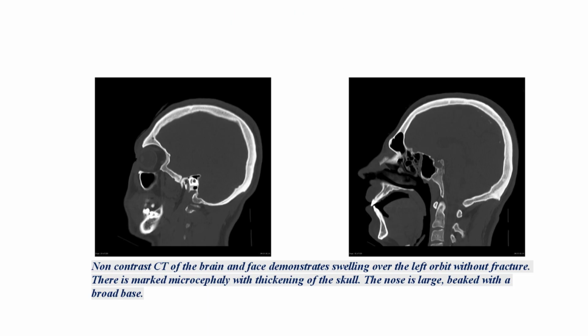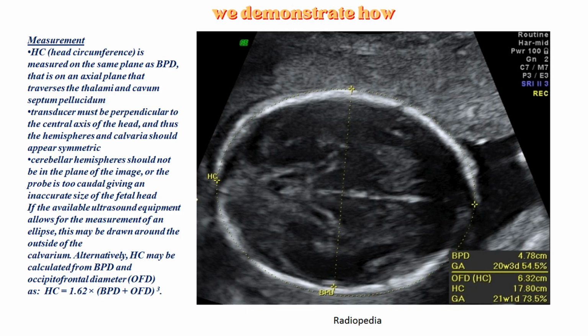In this slide, we demonstrate how we can diagnose microcephaly, putting in mind that we will use the same parameters to diagnose also macrocephaly. Take your time here and pause the video to read.